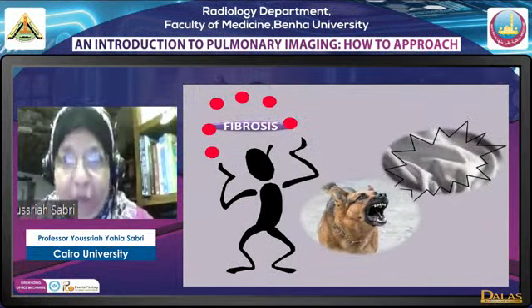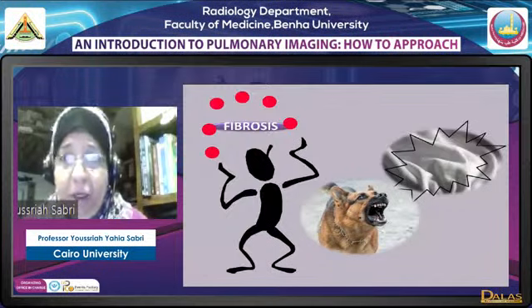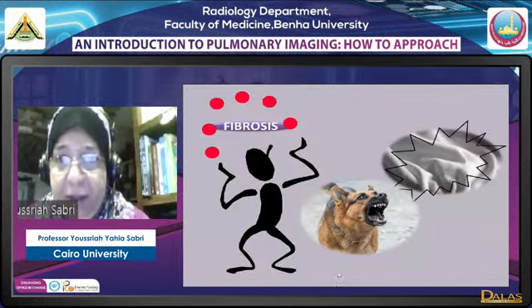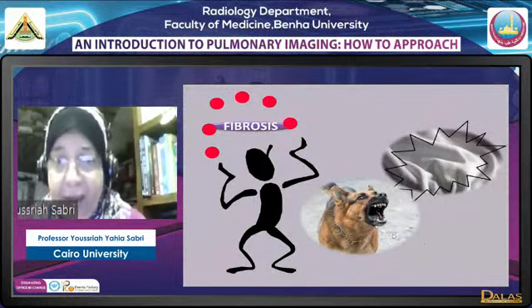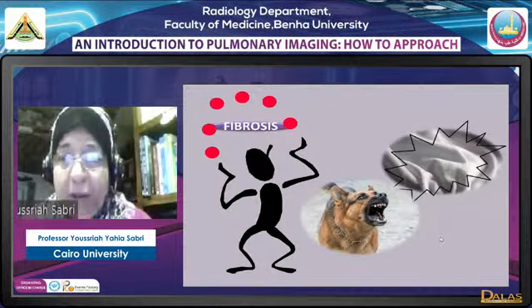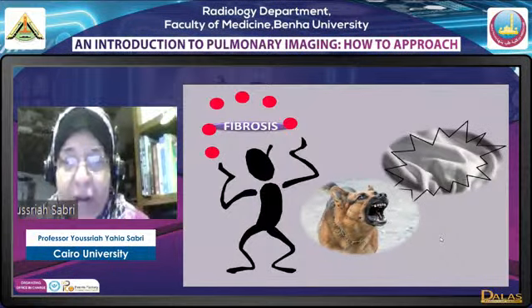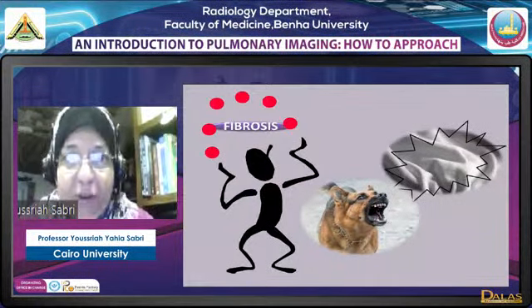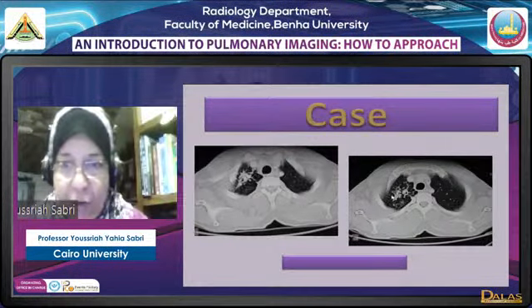Now, regarding fibrosis, I like to compare the appearance of fibrosis to a small story where we have a white cloth that a dog has turned into pieces. Now imagine the white cloth torn into pieces by the dog. Anything that you can imagine happening to this white cloth, you may see in the pattern of fibrosis. Now here we have again fibrosis, the white cloth torn into pieces, but it is apical.